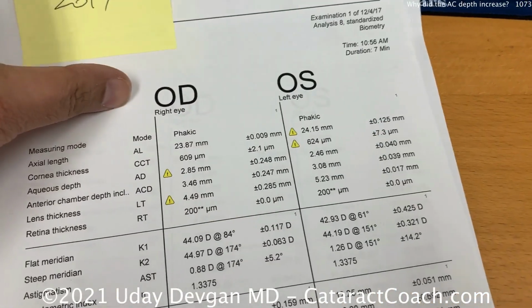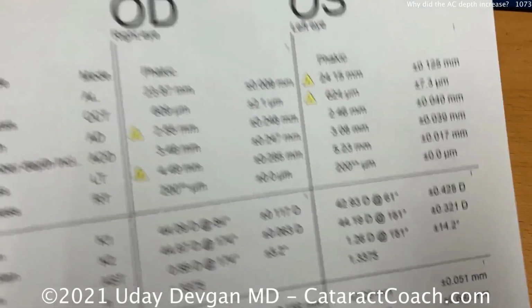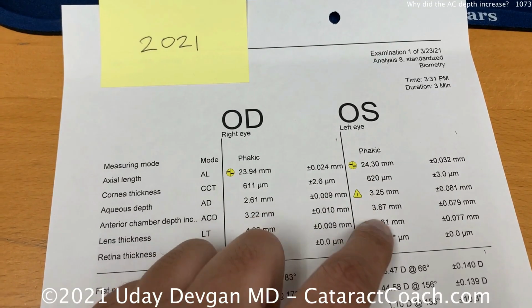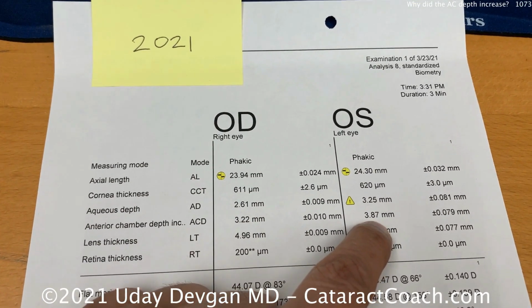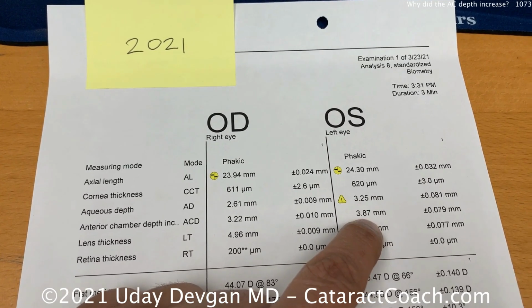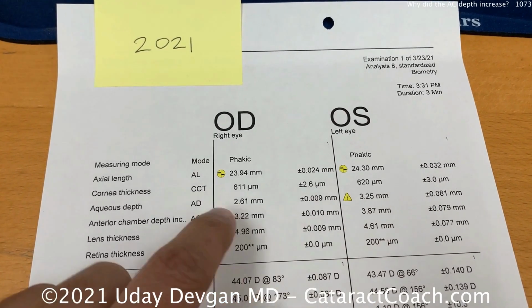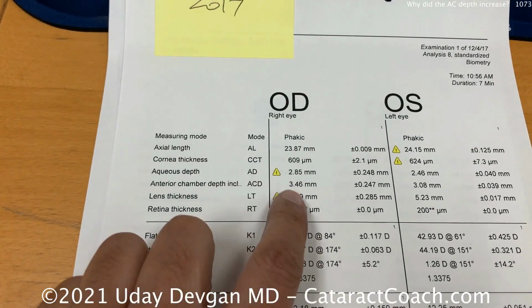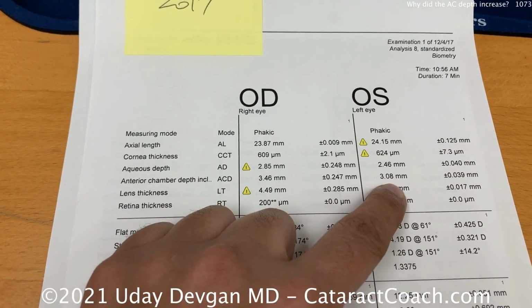Well, the patient didn't have surgery then. He actually came back to our clinic now in 2021. But now look what happened. The AC depth went to 3.87. Why? What's the difference here? Now look at the other eye, 3.22, and going back to 2017, 3.46. But why is there so much variability here?